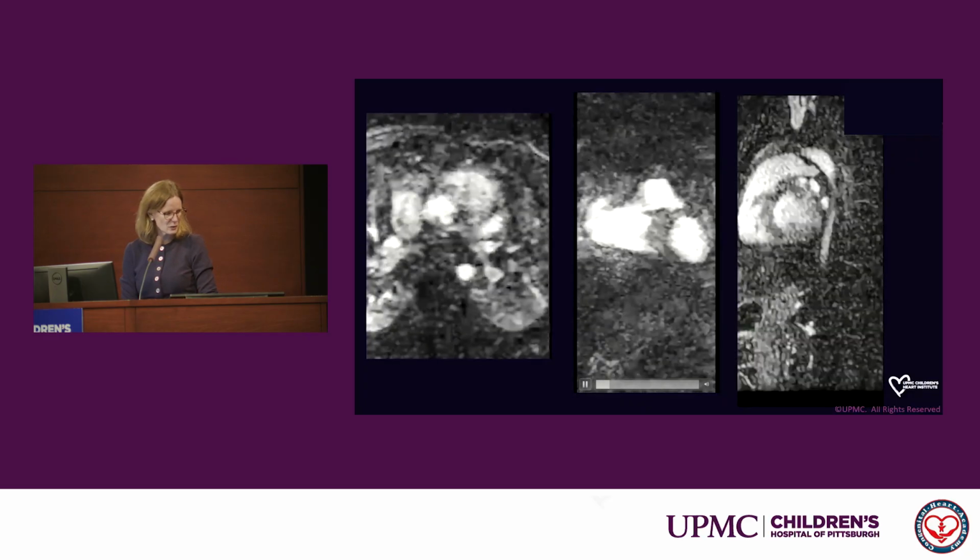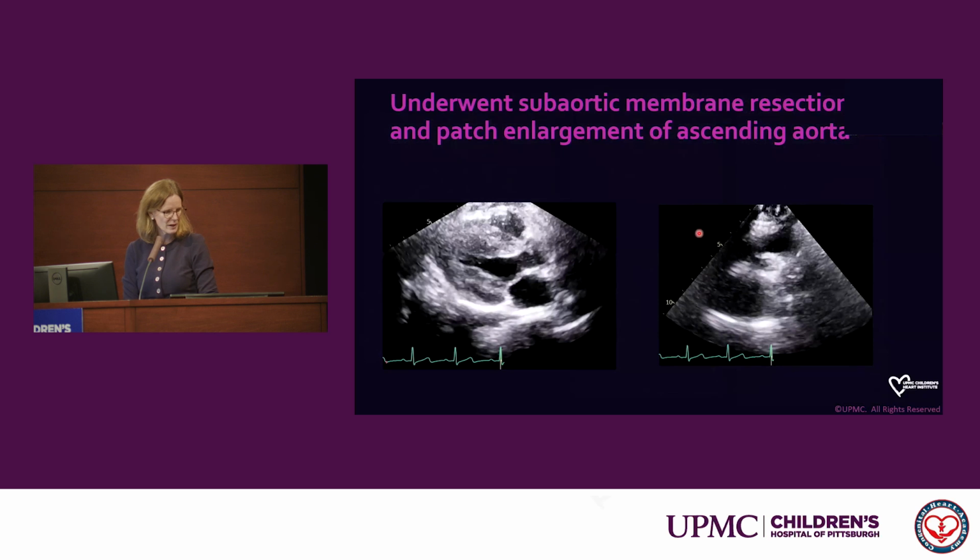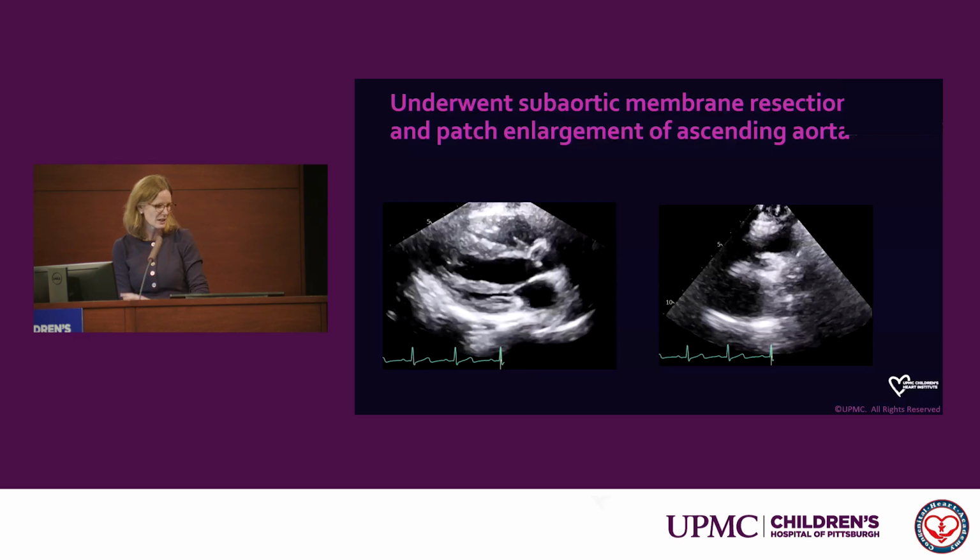implications. And so this child went to the operating room and had resection of the fibromuscular subaortic stenosis and also had some patch enlargement of his sinotubular junction and ascending aorta.